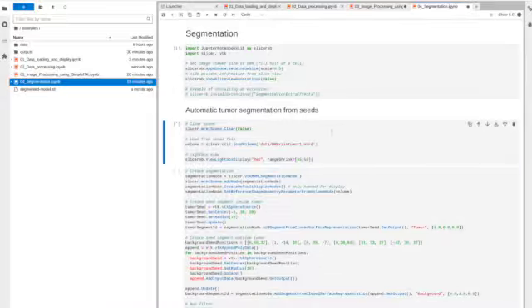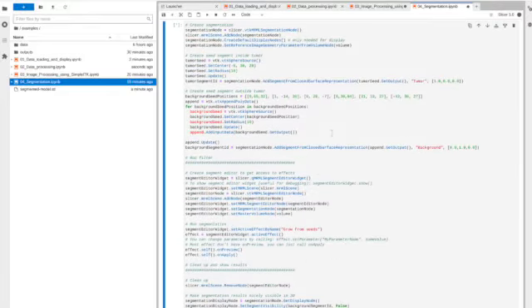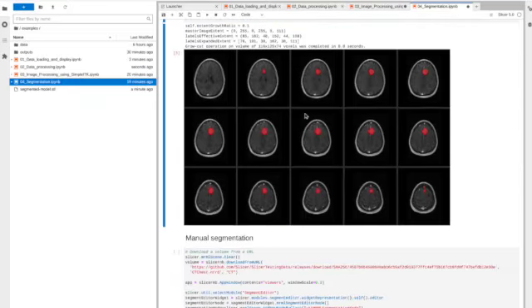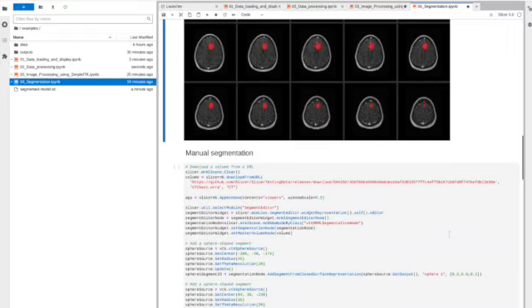And then here's the last notebook here. This will walk you through essentially segmentation. This one may actually, oh, no, okay. So here it is. So it's actually able to segment where the tumor is in this particular angle.